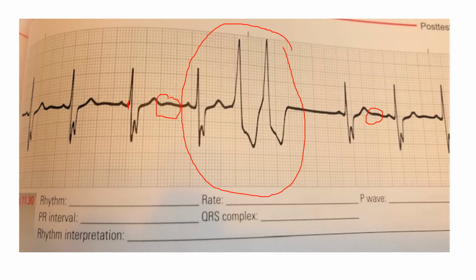Let's just erase all this. So this rhythm is sinus rhythm with a bundle branch block, a unifocal couplet PVCs, and a U wave.